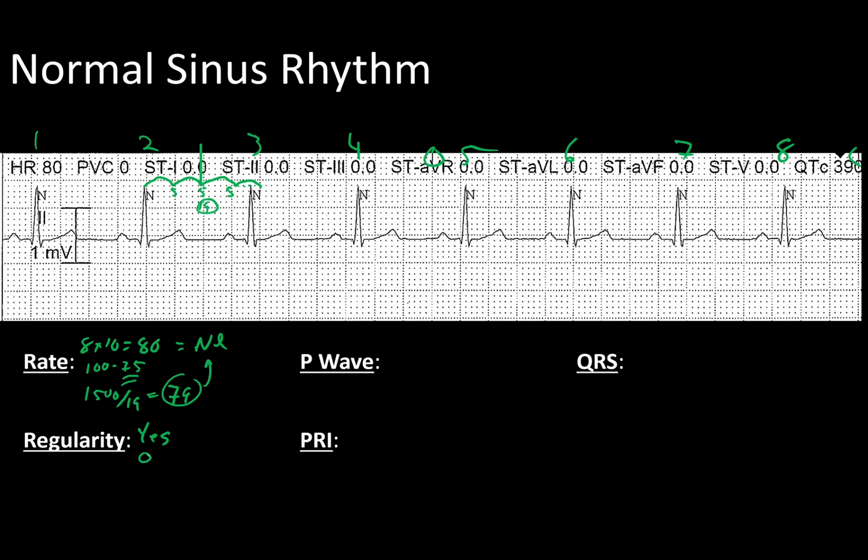Again, normal. Back to regularity. It is regular. We have no pattern and no ectopics. What do we have for our P waves? Now, I'll go ahead and mark those out for you real quick, etc. And they all appear to be upright and uniform. Are they regular? Well, they certainly appear spaced out regular, but of course we can do the mark here, measure these out around 19, use a pair of calipers, measure out the rest of the way, but they are regular.